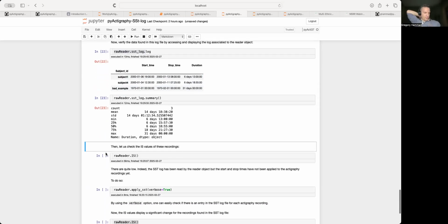And then maybe to illustrate that, it's even important to clean the data. You can calculate maybe the inter-daily stability, for instance. I'm always using this one as an example of things that you can calculate.